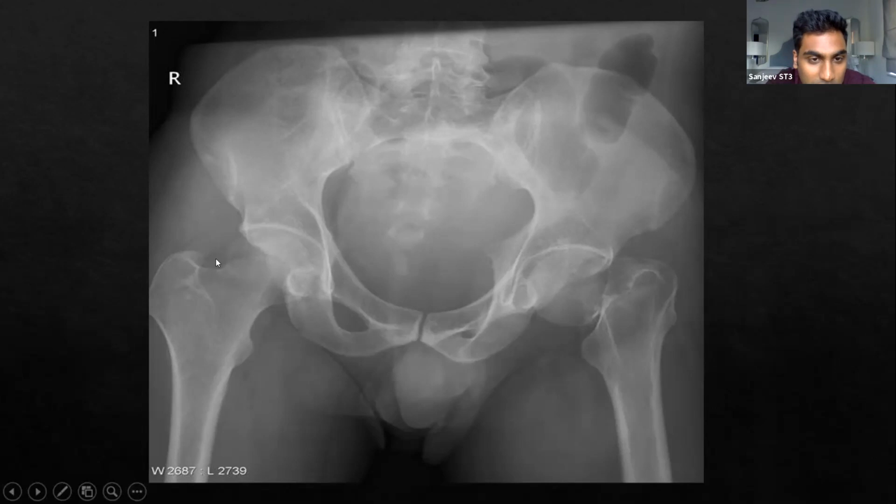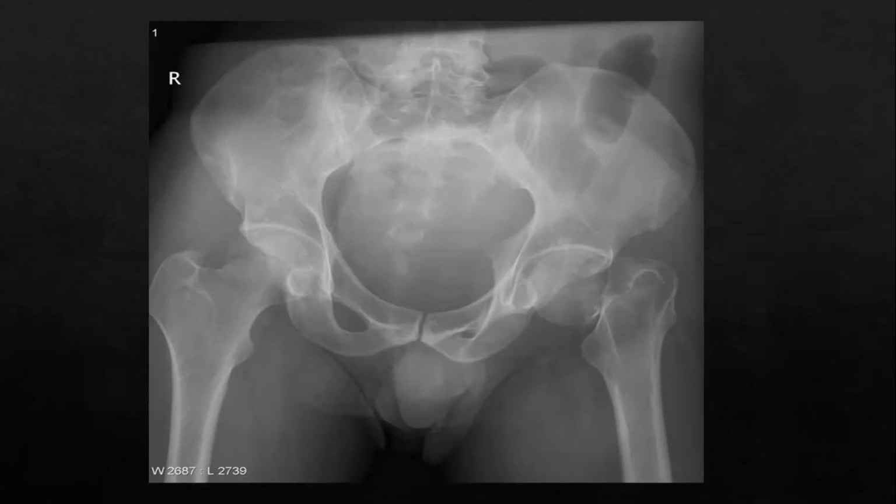So you see how, with a completely undisplaced fracture, you'll have a line going through here, but you see this nice shape being maintained, yeah? Here you've lost that shape. So there is a bit of movement, a bit of displacement going on. So you'll say minimally displaced, okay? That makes sense, thanks. Okay, fantastic.